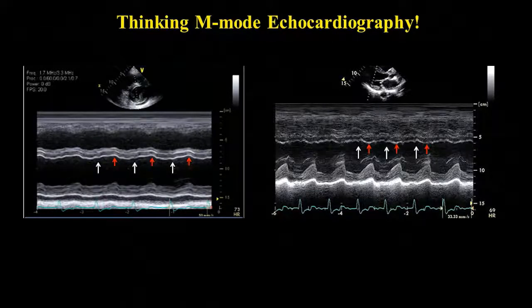So there is dysynchrony, contraction of the myocardium is not synchronous and is not effective, as opposed to case B, which also has a left bundle defined by this beak, by the white arrow, but in systole the myocardiums actually oppose each other. The septum and the posterior wall are coming inside.